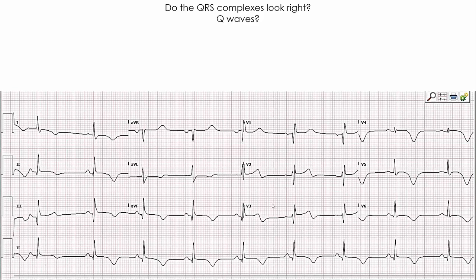And what about R wave progression? Well, in a QRS complex of this shape, it's not really worth mentioning, okay? So we've got this RSR pattern. We're already quite positive in V1, so in terms of our R wave progression, that's already abnormal. Remember, that shouldn't happen until we're in V3 or V4. So these are abnormally shaped QRS complexes, and although we haven't discussed this yet, this is because this is a right bundle branch block pattern.